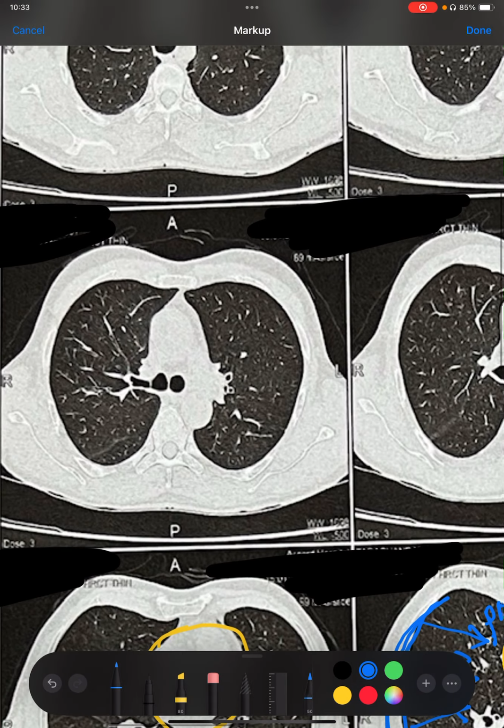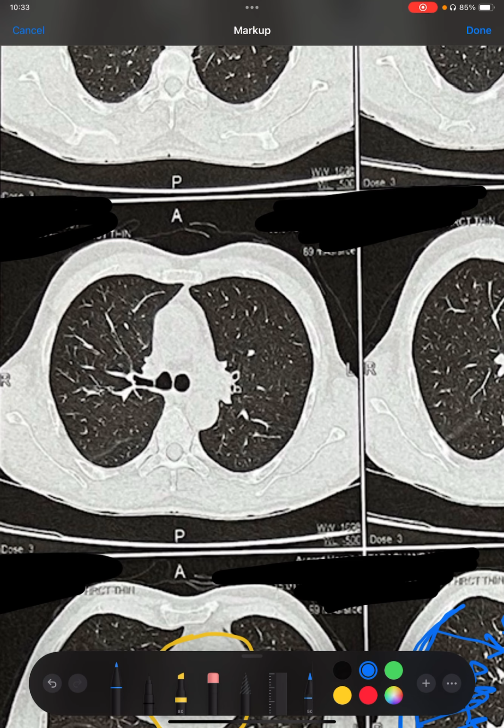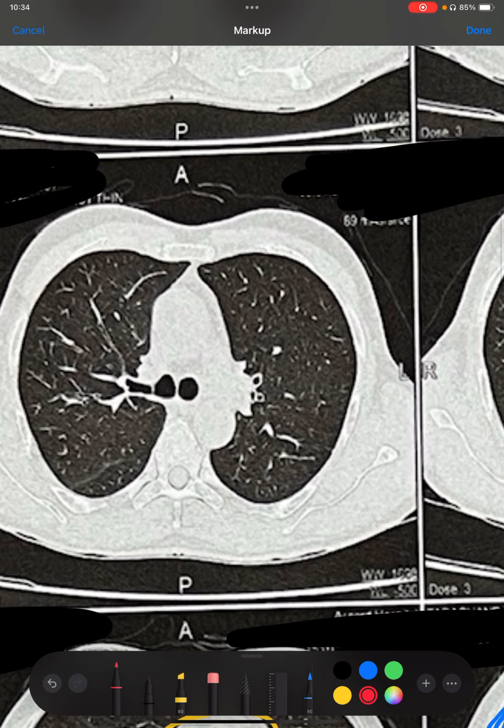So in this CT scan we can see lungs, they are pretty okay. There is no any patch. The lung is pretty decent. There are no significant fibrotic bands. If there is a consolidation, means pneumonia, there will be a white patch which may be like this or which may be like this. This will be definitely white, not red. And just to show, I'm showing this may be like this.